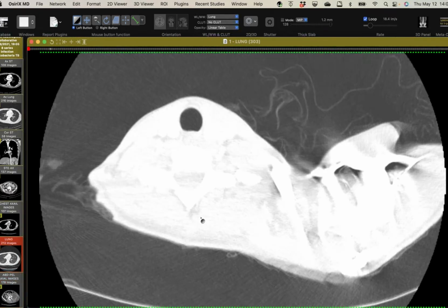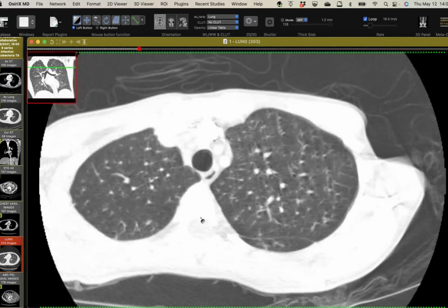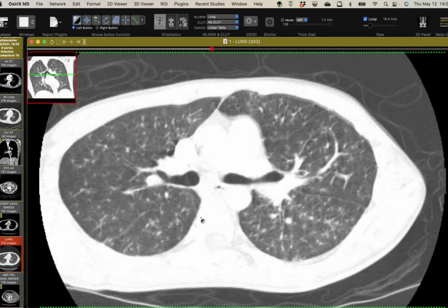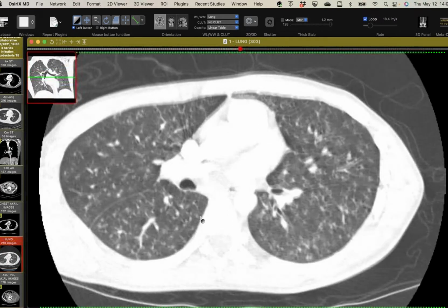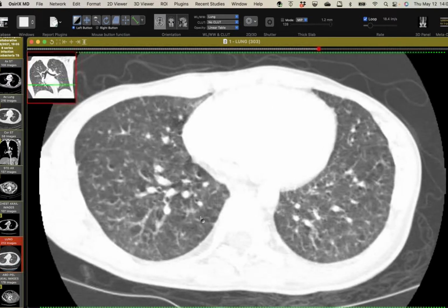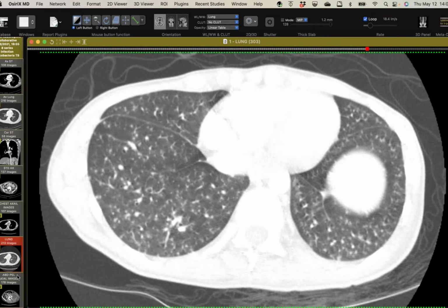He also had a chest CT at the time that shows there's a lot of motion artifact, but you should be able to make out a background of multiple tiny nodules. So he has this miliary pattern. So they sampled some of the fluid in the pelvis, and this was all Mycobacterium tuberculosis, and it was all pan-sensitive. So he was started on therapy, underwent a bunch of drains of those abscesses.